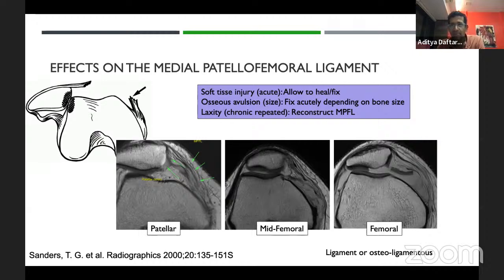What is the role of the lateral patellofemoral ligaments and how to? The lateral patellofemoral is actually more robust. So you can see here, this is the lateral patellofemoral ligament here. Both ligaments together play a role in stabilizing the patella. I think the biomechanics of the ligaments and how they work and function is a little bit beyond the scope of what I know, and I'm sure there are people in this audience who would know better.